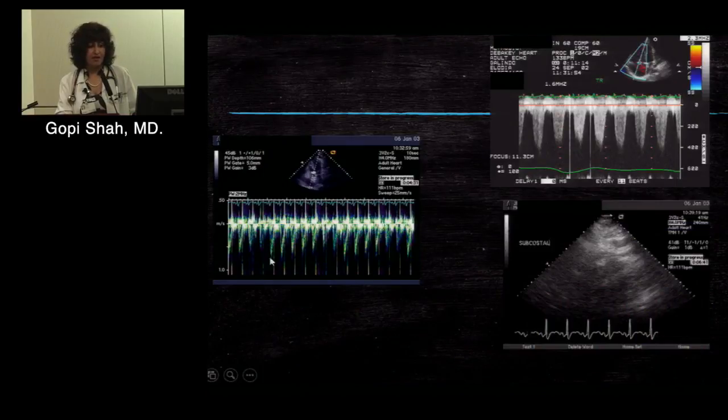This is 64 and plus, and you have the respiratory variation. So this shows the importance of understanding that traditionally we expect the low pressure chambers to collapse first, and that would be expected, but two things decide. One is how high the pressures are in the chambers, and the other is where the effusion is located. So you can have a loculated effusion causing a very localized compression of the chamber.